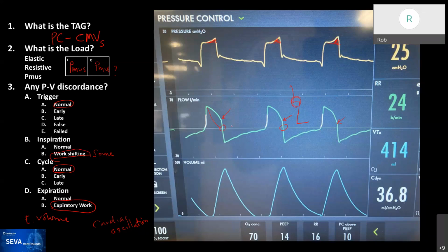I like that. There was another, actually, I remember because we read this one also in Spanish last week. Another thing that made me think that this was expiratory work was the fact that the patient got this amount of inspiratory volume, and then the patient exhaled more than that. And so yeah, that's a good sign. And so he was just exhaled. I mean, yeah. How do you differentiate that from a leak? The leak should actually look like this, one over here. Okay. But bigger. I mean, you would expect some here, and then it comes out. Okay, that's good.